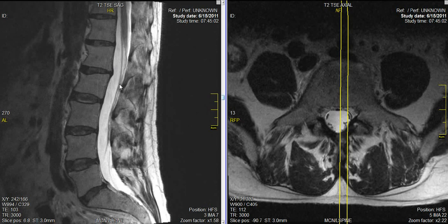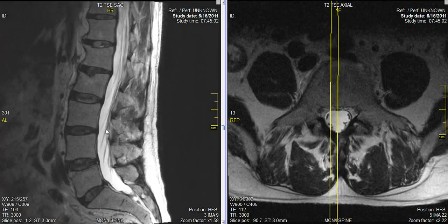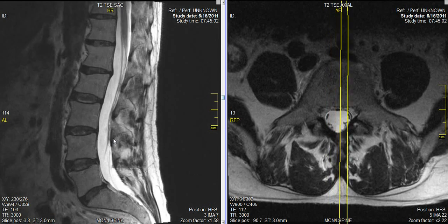Below that are individual nerves, which are these wavy lines. If I scroll side to side, we can see these little lines here are the nerves. So the solid spinal cord is not present down here in the lower part of the lumbar spine, but rather this bundle of individual nerves. The white in here is water or spinal fluid.